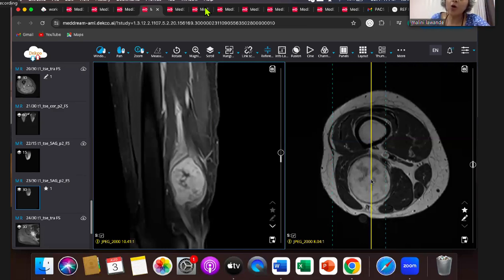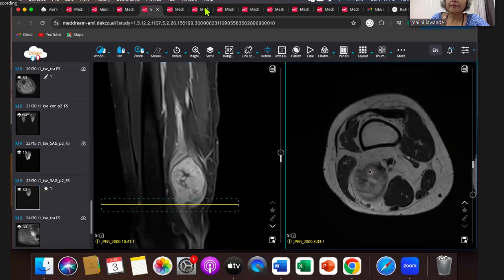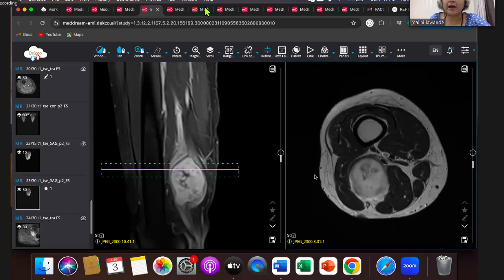Target sign, more common in neurofibroma. And typically, again, history, can they be biopsied? Yes, they can be biopsied. And clinically also, they have that Tinel sign positive, very painful. Okay. Let us move to the next one. So see, if the history is fitting into a slow growing one and it's very well defined, imaging wise, everything is fitting, they may just operate. But biopsy can be done. There is no problem in that.